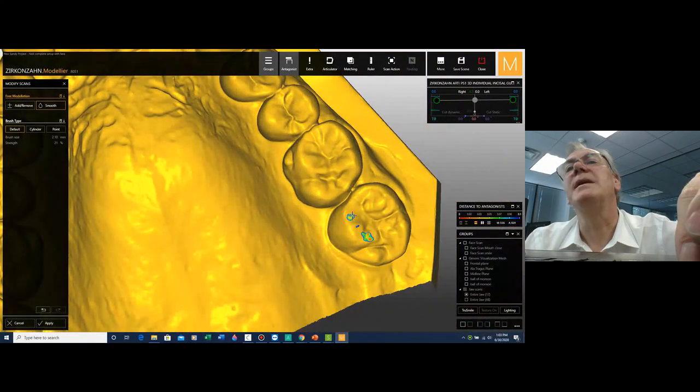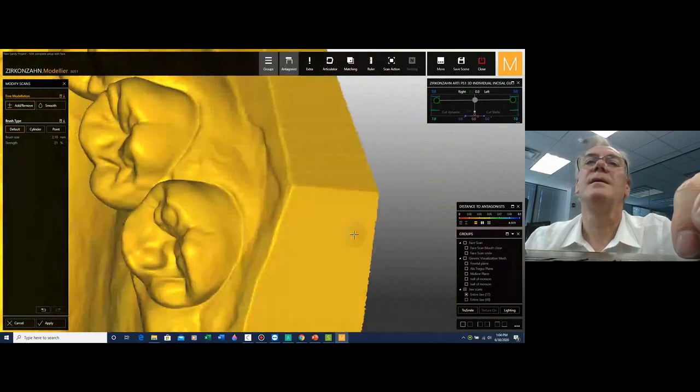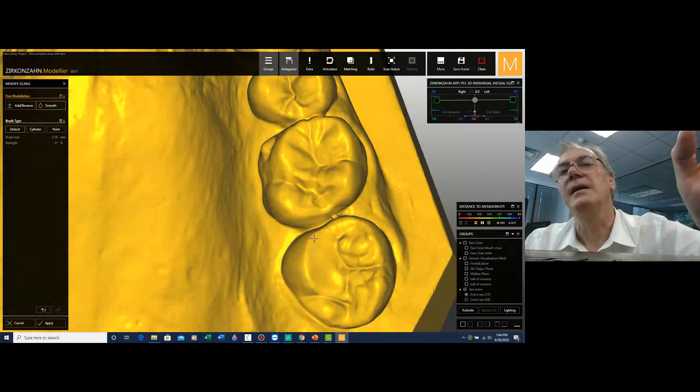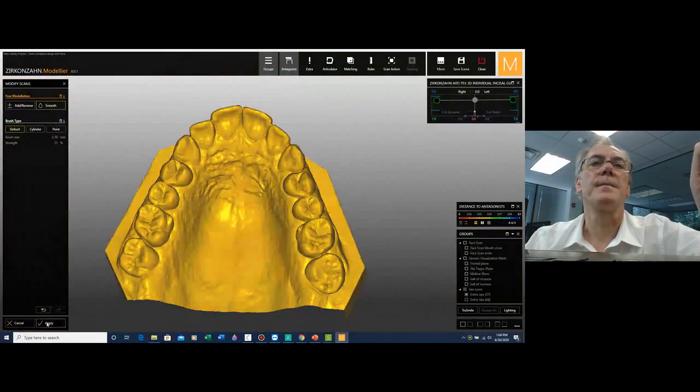But now we know that. So in the therapy, most probably we'll keep in consideration an ortho treatment. It's really a lot. Let me smooth it quickly. The whole cusp needs to change angle. I don't think we'll be able to do that with an odontoplasty. Most probably we're going to have to do it with an ortho treatment.